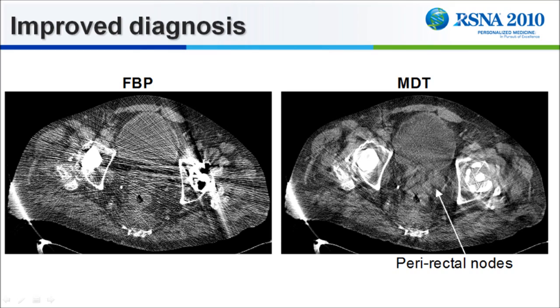Unfortunately, this was done as a retrospective study, and by the time we saw this image, the patient had already died. He was thought to be cancer-free at the time of death. An autopsy showed recurrent rectal cancer.